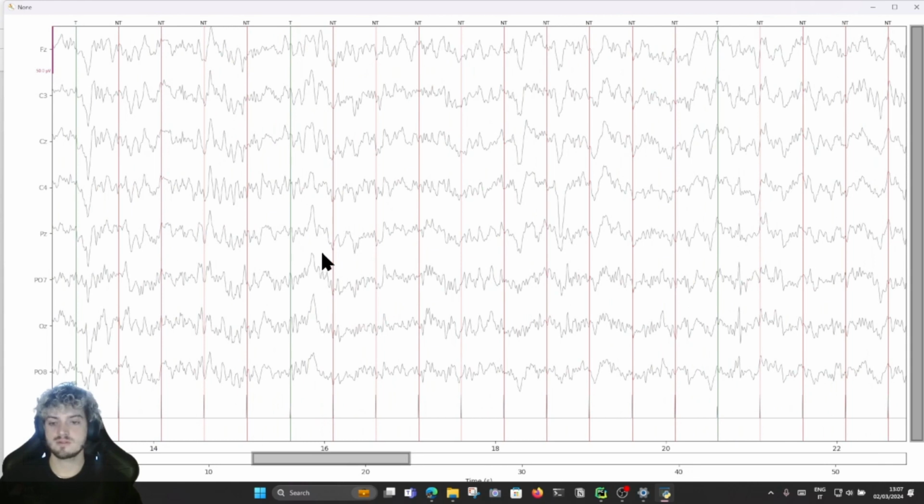You can also do an extra thing. They have a function in MNE where if you click on the channels here, you mark them as bad. So you can basically remove them from the analysis. This is useful when you have a very noisy channel, but I'm not going to do it because my goal here is to prepare you for online BCI. And normally in online BCI, you cannot visually inspect the data and apply some correction. You have to use some heuristic on a software level.